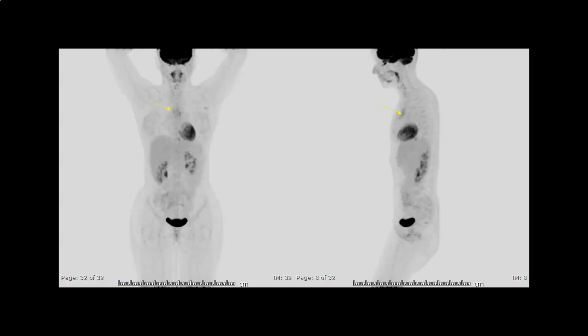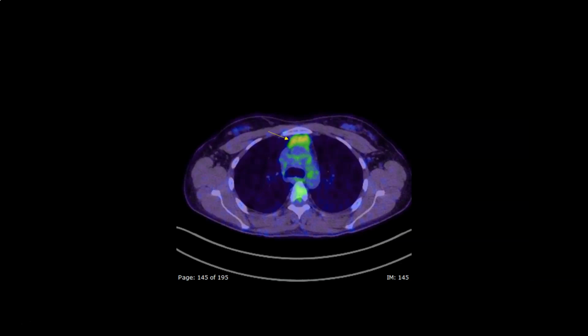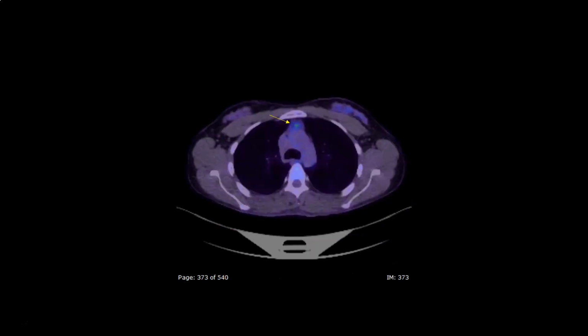Now, on a PET-CT done after treatment, there has been an active uptake of FDG again in the mediastinum, this time more anteriorly located. New disease activities? The answer is no. This is activity in the thymus due to thymic rebound, which disappeared spontaneously on a subsequent PET-CT.